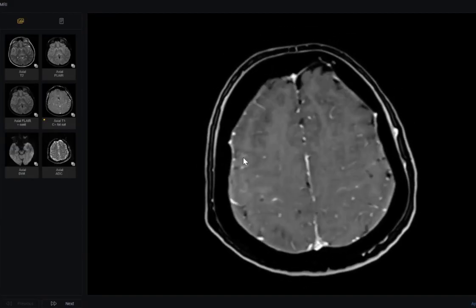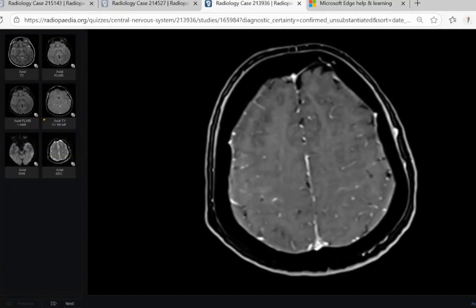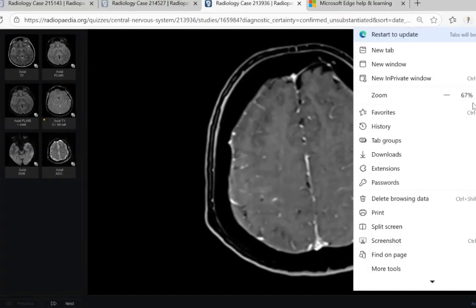Also, doctor, can I ask a question regarding another previous case? The case of brachial plexus. We said fatty infiltration in the muscle. If it's fat, why doesn't it drop the signal in the STIR? Because in the STIR images, the signal is still high. See, in the STIR, there are two entities in the last case.